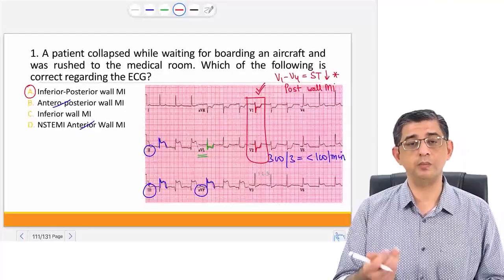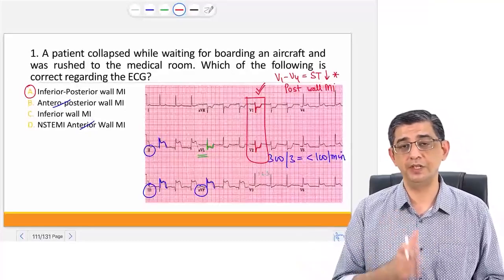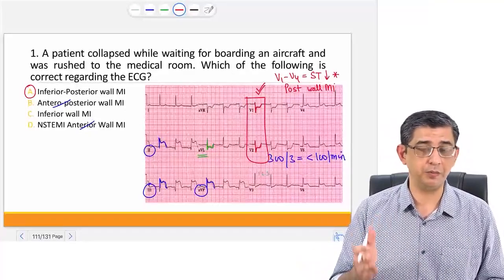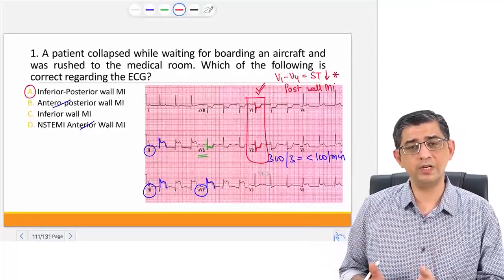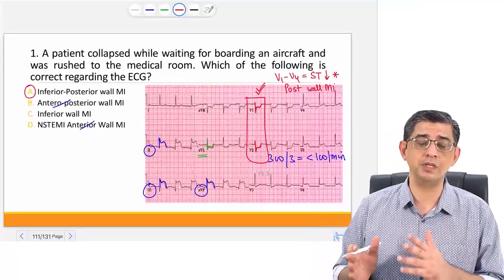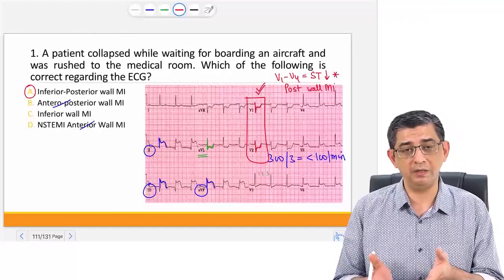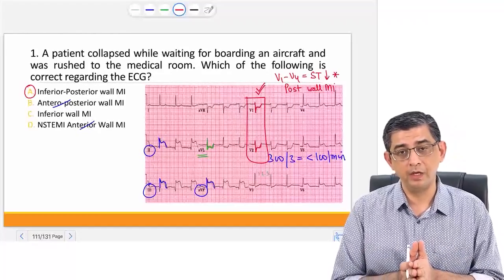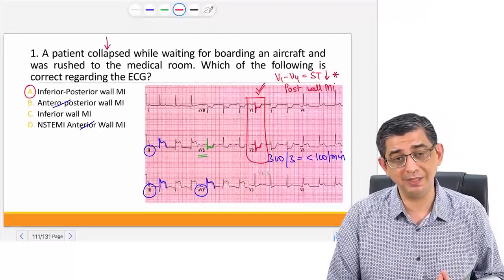Anyway, whenever you read about a person collapsing suddenly, it's going to be a question of a tachyarrhythmia like ventricular tachycardia or ventricular fibrillation, or maybe a PSVT. These are the usual 3 arrhythmias that are asked. So when I looked at this ECG, I tried to be fast, because if I go by the routine steps in the ECG, I might keep on analyzing and lose valuable time. So when you read about a crashing patient, you have to think in terms of a tachyarrhythmia.